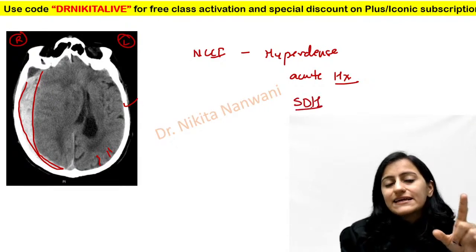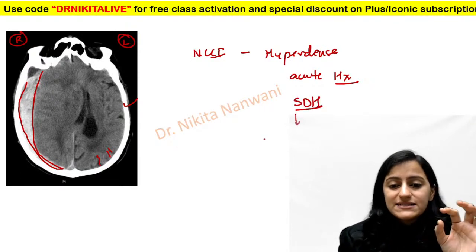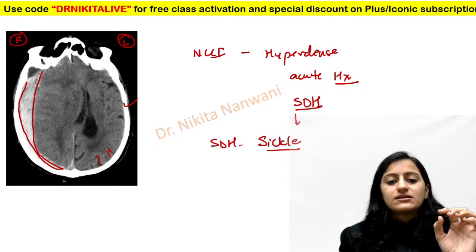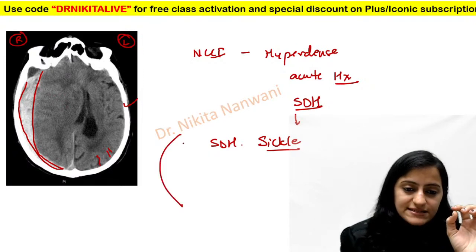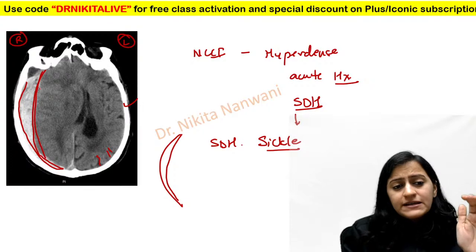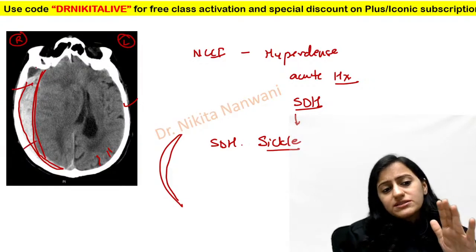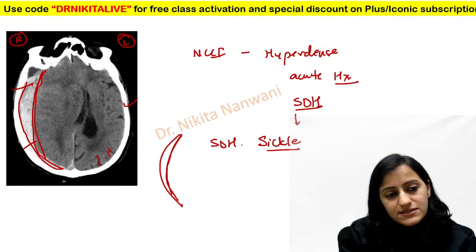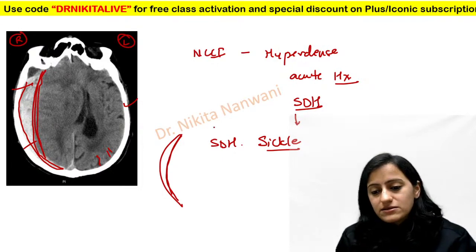It is SDH. Why? Because remember, SDH, S for sickle shape. SDH is sickle shaped. So you can see this sickle shape, and you have the concavity here, right? So it can cross the sutures, going in the front and back. It follows the brain surface.